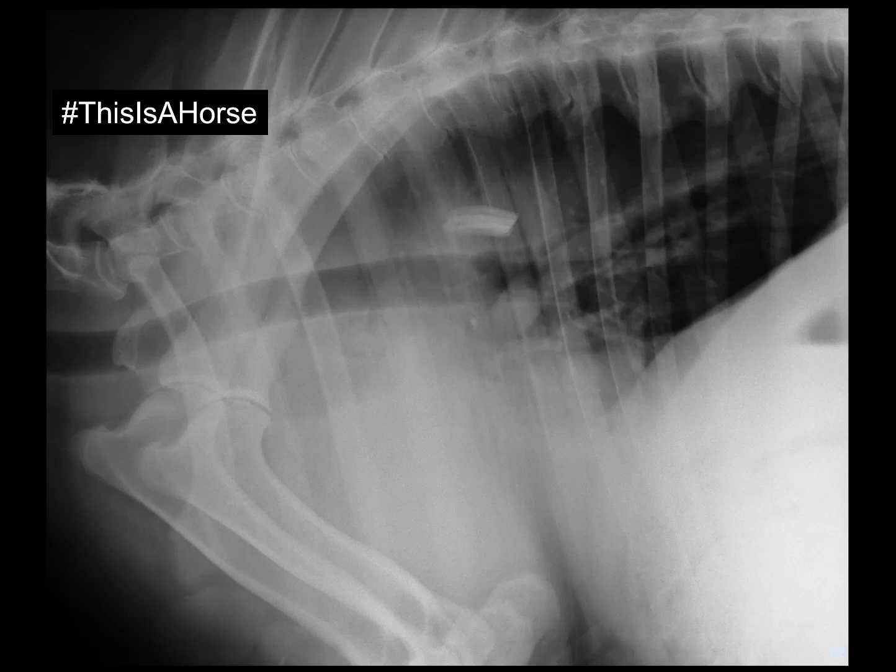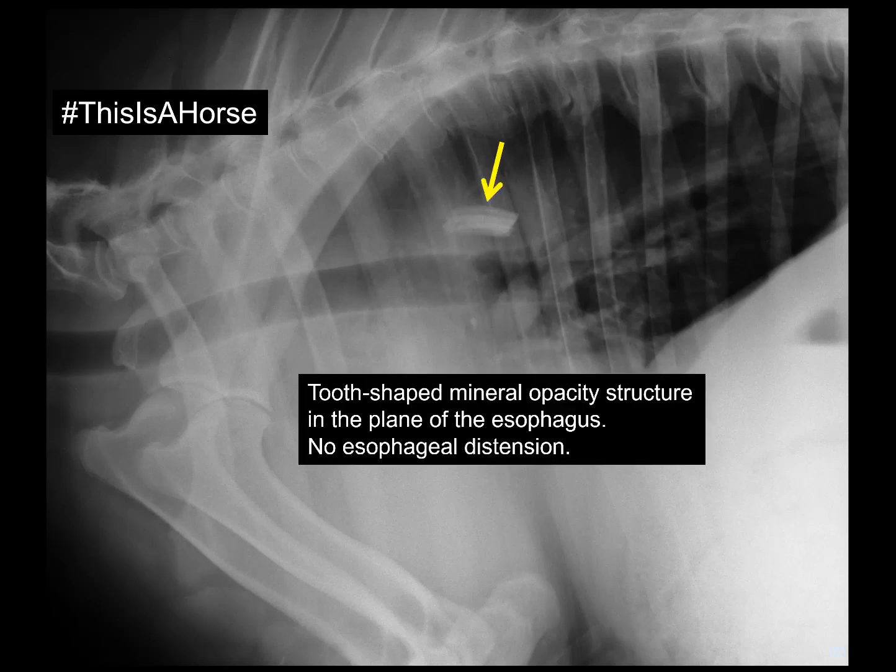Horses can get esophageal foreign bodies. This horse has a mineral opacity structure immediately dorsal to the trachea, so it's in the plane of the esophagus. It looks an awful lot like a tooth, as it turns out. So this horse has an esophageal foreign object, specifically a tooth.